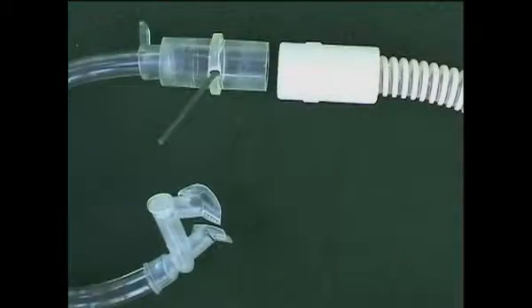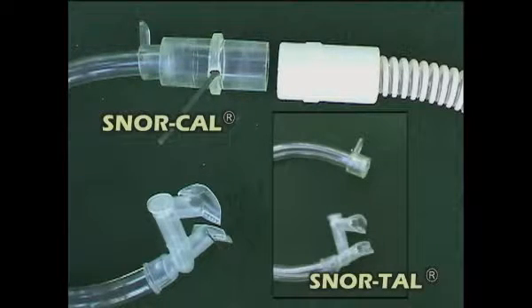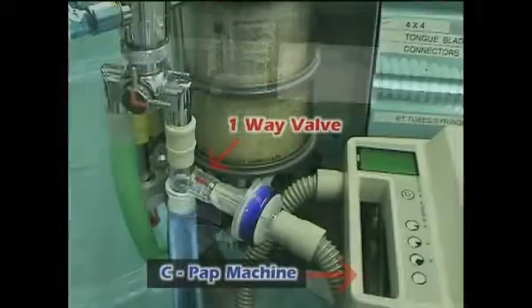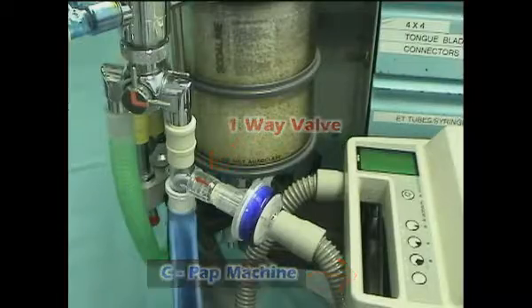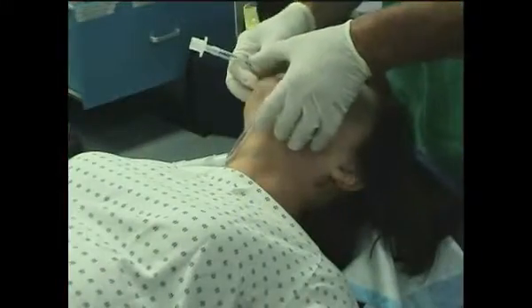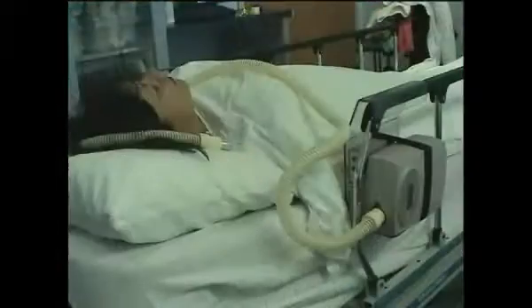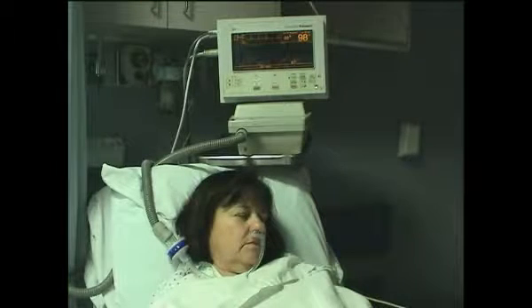The snore CPAP assist linkage, or snorkel, configures the snortle with a vented connector to prevent the rebreathing of carbon dioxide. Attached to a CPAP machine, the snorkel is indicated for the delivery of CPAP. This arrangement can prevent obstruction upon extubation at the end of an inhalational anesthetic and will optimize gas exchange during transport to and through the recovery room.